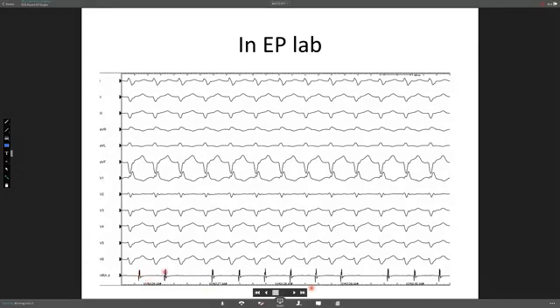So you see some atrial activities. The ventricle is fast. The ventricle is the source of the tachycardia, so it's fast. It does not stop. But the atrium is inconsistent, regardless. And this is not the point of discussion, whether there is a VA conduction or not. But there are some gaps, like this gap and this gap, where there is no atrial activity. There is an opportunity, if you look carefully at the longer rhythm strips and on the telemetry.